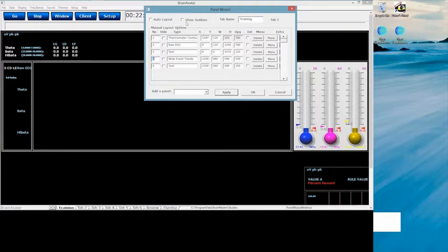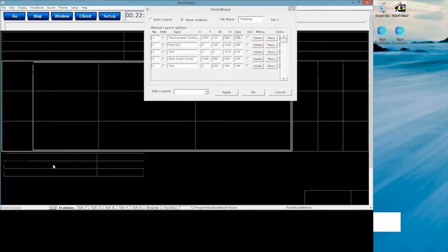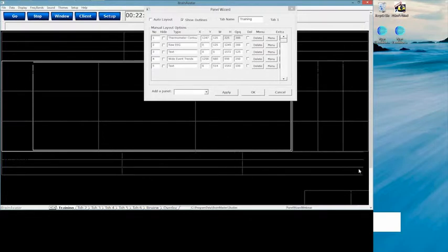This display that's right down here is actually a brand new display. We just added it in the last couple of revisions, the ability to show the overall percent reward in our basic amplitude trainings. We had a lot of people request that, and coming up we are going to get a nice little feature called rewards per minute that's also going to be added on there.